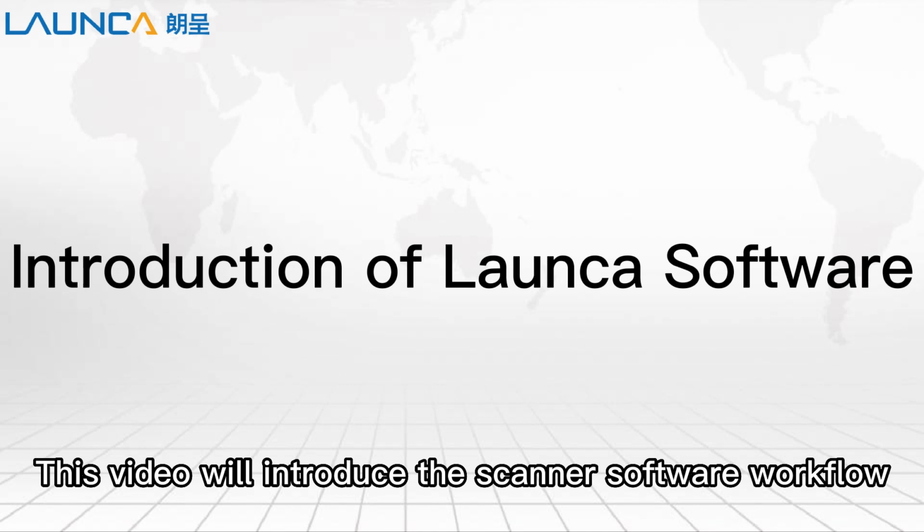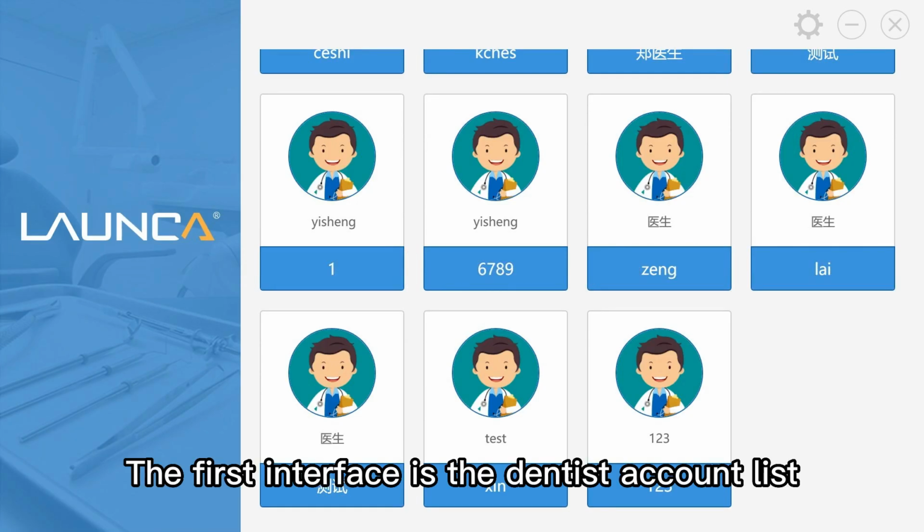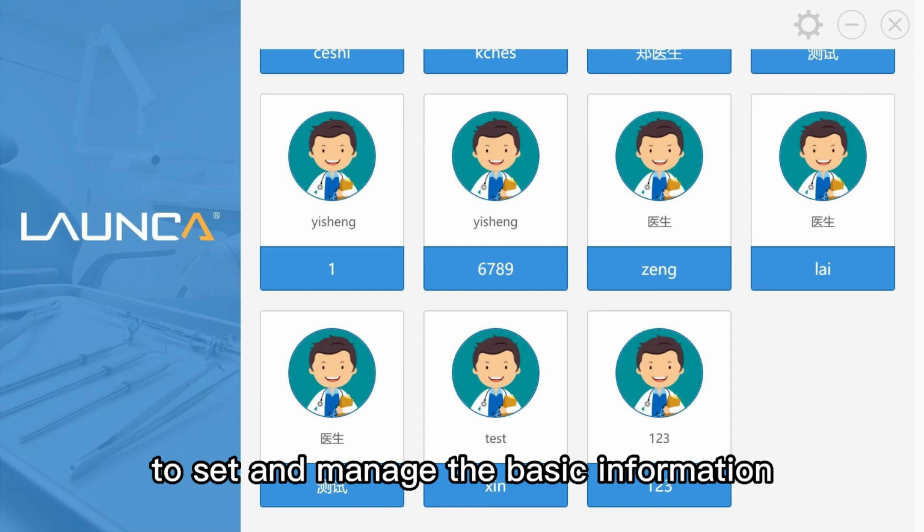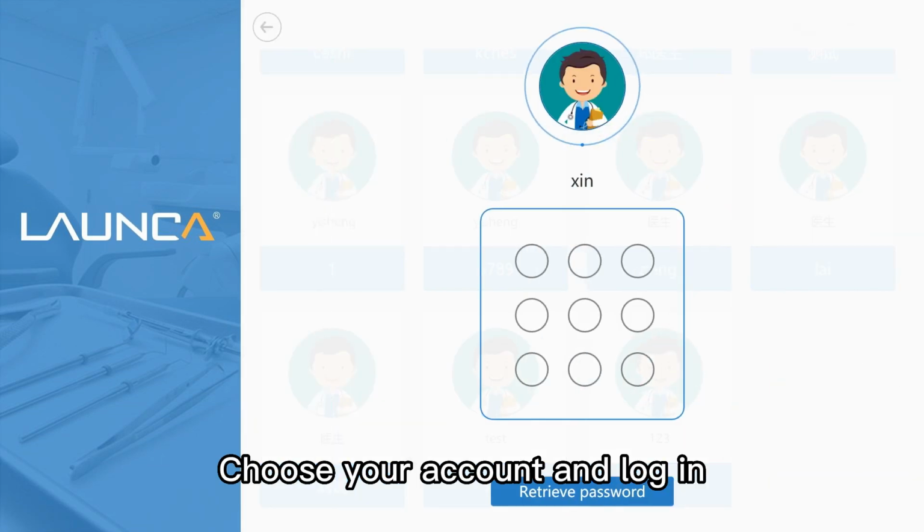This video will introduce the scanner software workflow. The first interface is the dentist account list. Click the setting logo in the upper right corner to enter the management software to set and manage the basic information. Choose your account and log in.